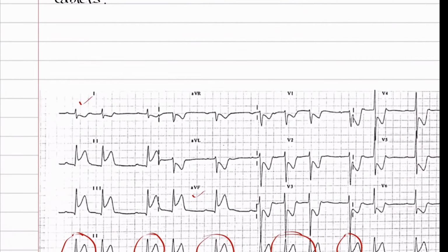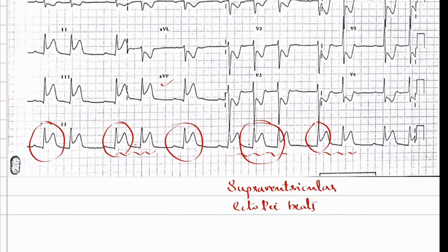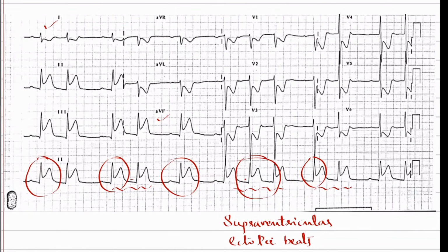See, lead 1 is positive and lead aVF is also positive. If aVF was negative, then you would check lead 2. If lead 2 is positive, then it is a normal axis. If lead 2 is negative, then it could be a left axis. Here lead 1 and lead 2 are both positive, so we can say that it is a case of a normal axis only.